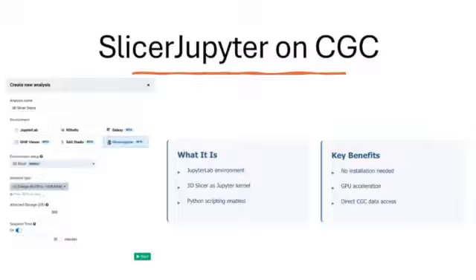First, because it's inside of Jupyter, it is running Python. So all the Python packages are available, and you have Python scripting fully enabled. Of course, because it's on Data Studio, it joins a family of other super popular Data Studio environments: JupyterLab, RStudio, Galaxy, OHIF Viewer, SAS Studio, and the newcomer, Slicer Jupyter.